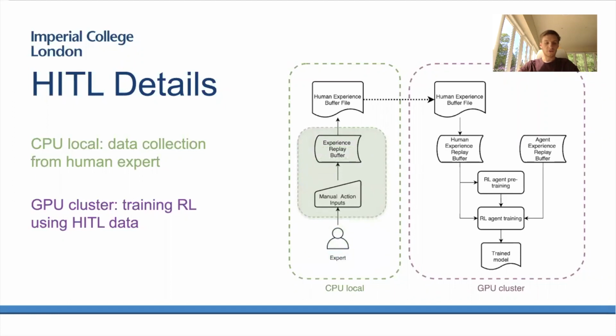The data for each episode is recorded as a dictionary. Recorded data includes the states, actions, and image name. Once the expert is finished collecting data, they can end the human in the loop session as follows.